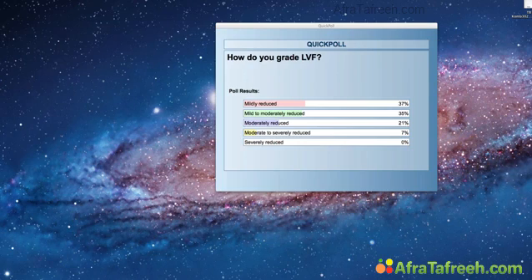Yeah, so I would agree with probably the majority here that left ventricular function is reduced. And I would also think it is somewhere between mild to moderate. So very good. I think all of you seem to be really learning something from this course and from this experience, because the way you quantify left ventricular function is just the way that I would. And of course, it's very difficult, eyeballing. Of course, it's also possible to use the Simpson method. With the Simpson method, I got an ejection fraction, as a matter of fact, of 48%.